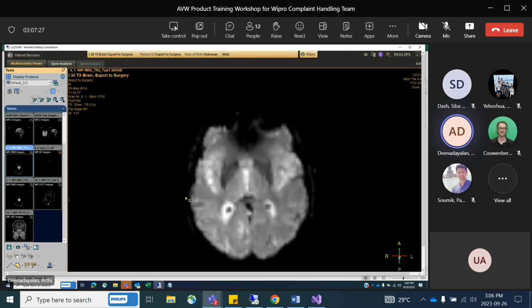When you don't have the proper dynamics, there are chances you will have dynamics, but still you will not have 20 dynamics. You will hardly have 2 dynamics. For example, DT0, DT3, DT6, only 3 dynamics are there, and they say I'm not able to load the series to fMRI. Obviously it will not load because you don't have 20 dynamics to load the data to the application. So that is a basic criteria for the series to be loaded to the fMRI application.